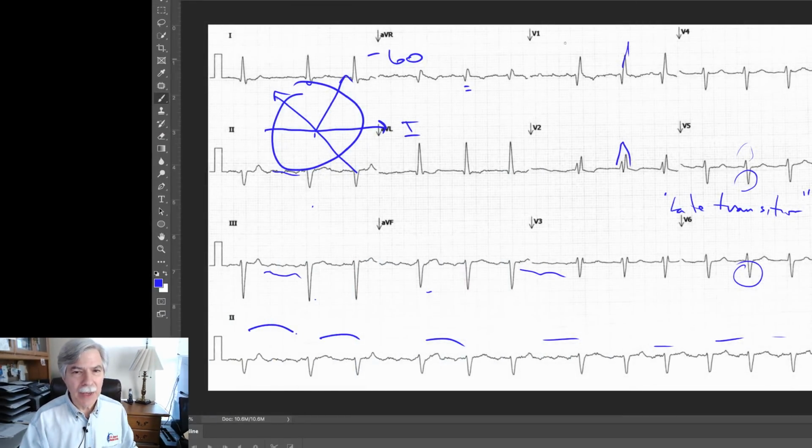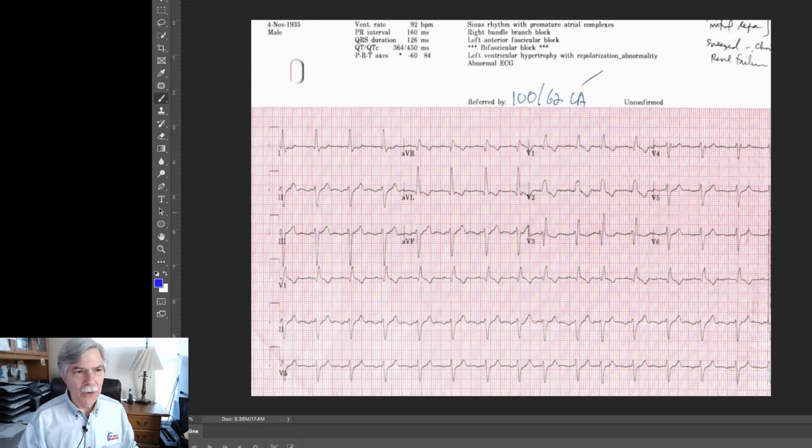And we will take a closer look at this, but I want to show you what the ECG looked like in my office. So let's see if I can pick one out. Okay, so this was the ECG that came off of my machine. And as you can see, something looks a little bit different. The patient is now pretty regular at a rate of about maybe 80 beats per minute, and actually 90.